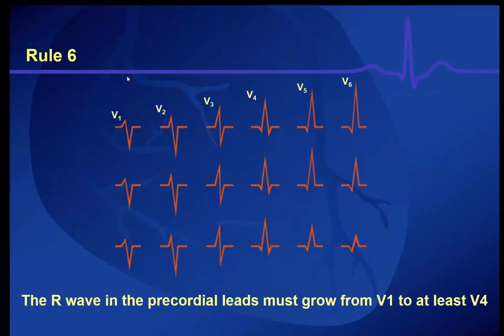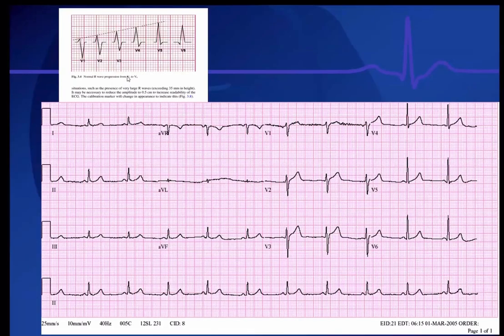This is the R wave progression on the top of your slide, and this is the way you can look at your R wave. Remember, the R wave in V1 is small, but it reaches its maximum in V5 or V6.